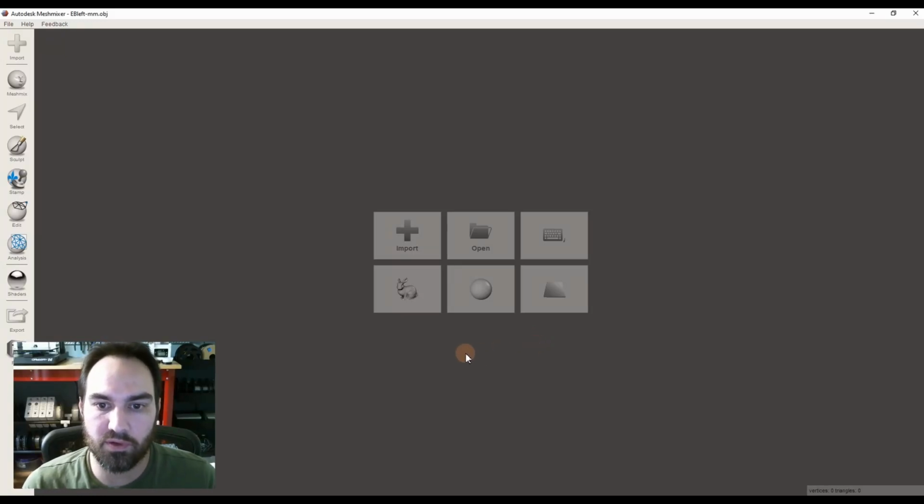This is the first video in our series, and this is the introduction to Autodesk Meshmixer. This is a really nice organic CAD modeling system. So any of our limb shapes, things working off of a mesh rather than dimensioned like mechanical parts, which you would use traditional CAD software for.